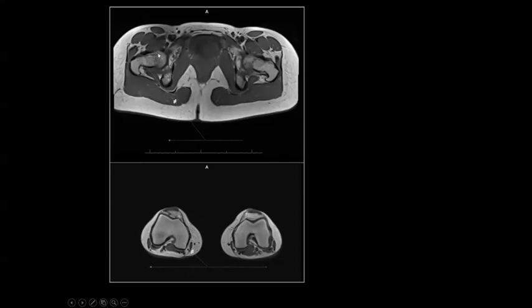So, for example, here, because you have the leg internally rotated by 3 degrees, it means the true femoral neck version is not 5, it is actually 8 degrees, because you need to externally rotate the leg by 3 degrees, and that will throw the femoral neck in more anteversion by 3 degrees, so 5 and 3. The corrected femoral neck version is actually 8 degrees.